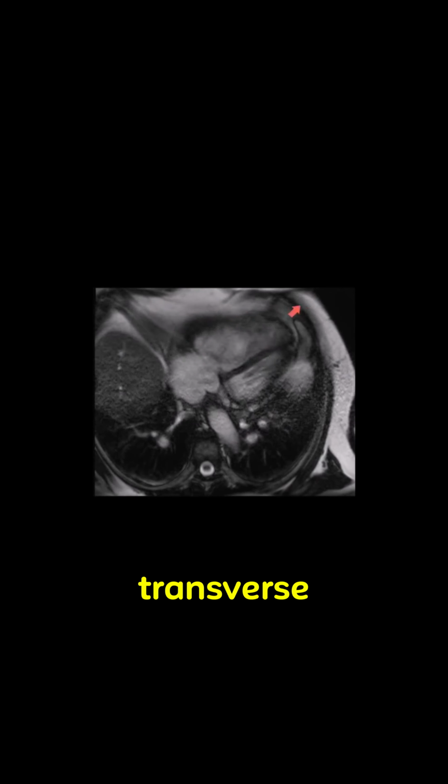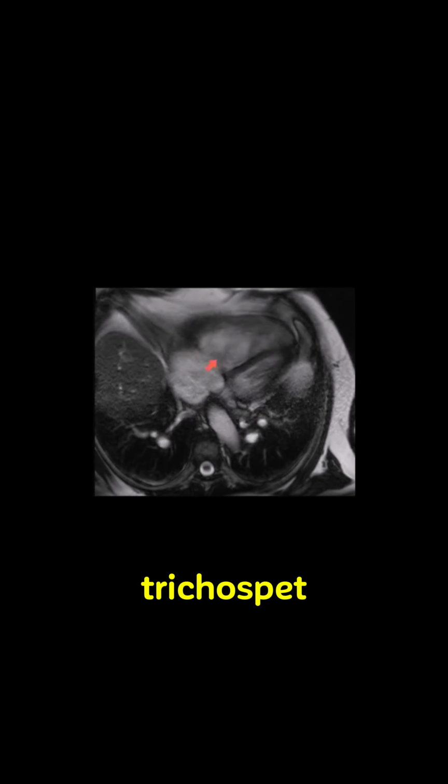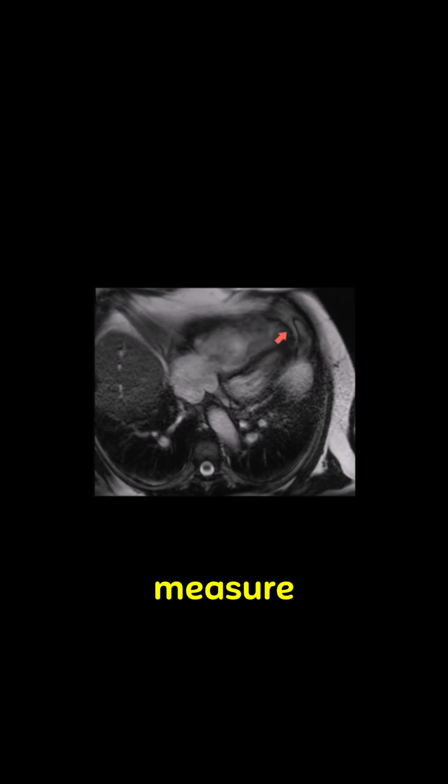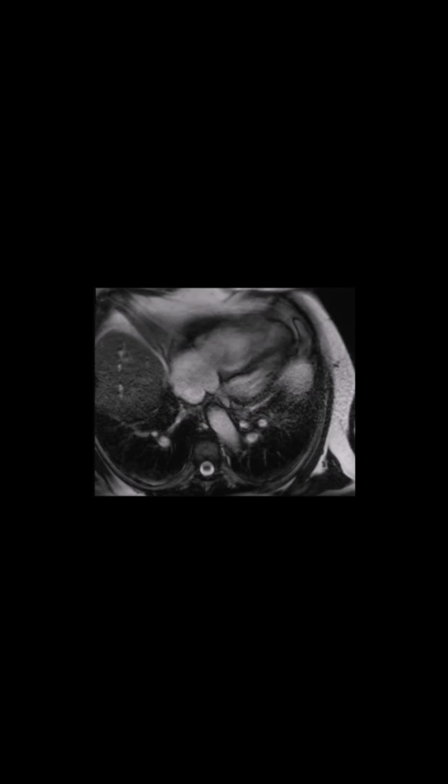In the true axial view, which is basically a transverse view through the patient's chest, rather like we get with the HASTE images, it's a little easier to work out where the tricuspid valve is and to measure the endocardium around the right ventricle by drawing a line around it to delineate right ventricular volumes in diastole and systole. So this is a true axial view of the right heart. We have the right ventricle here, we have the right atrium here, and the tricuspid valve in between.